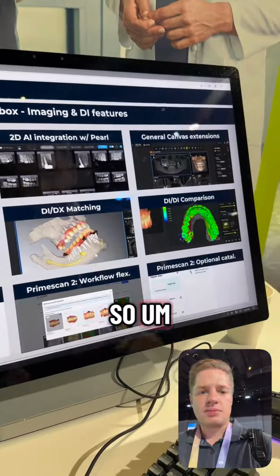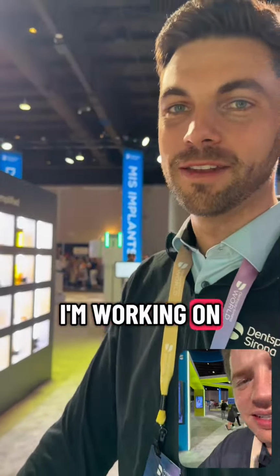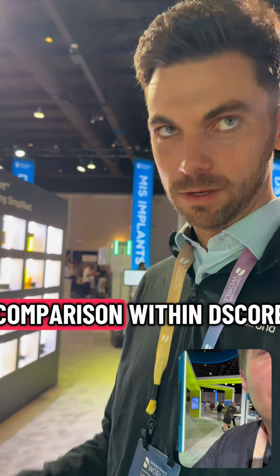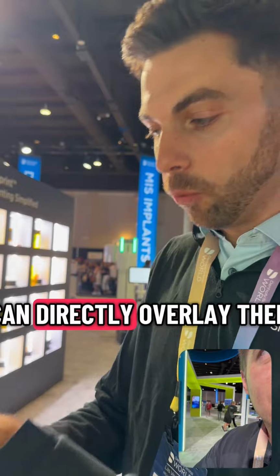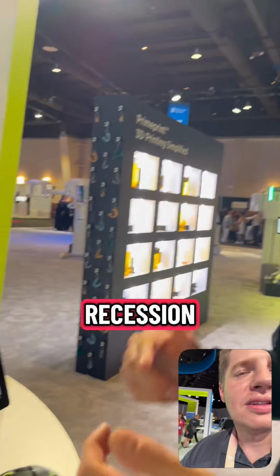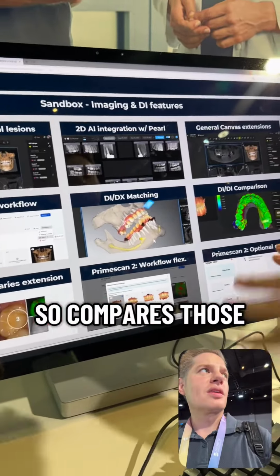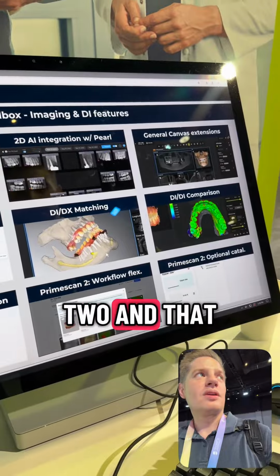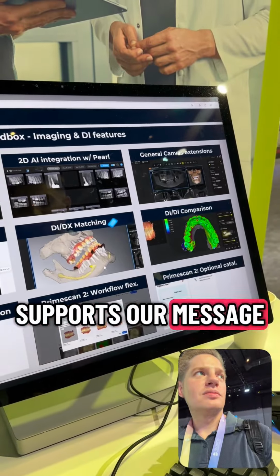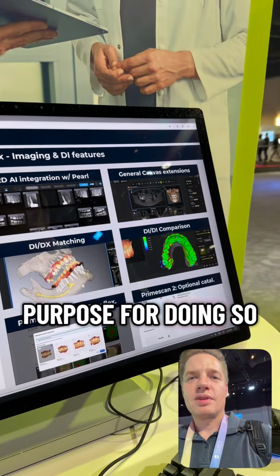So you might know AuraCheck. AuraCheck was one of our past products, but for sure we are working on a direct iOS comparison within DSCore, which means that you have two intraoral scans, and then you can directly overlay them, match them, so that you can see differences. For example, gingival recession, abrasion, a chipped tooth. And so it compares those two, and that supports our message: scan every patient every time, because then you have also the purpose for doing so.